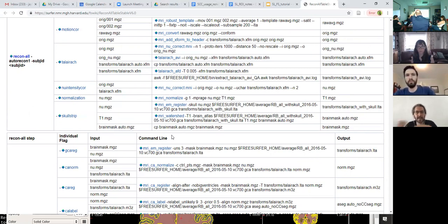If you run it, we have scripts for doing various steps of the process. If you're running it and you're doing an editing, if you're doing a review with edits, we have this process that Bobby and I developed to try to cut down on the chances that you're going to really mess something up. But at the end of the day, it's still possible that one could overwrite some data that's difficult to recover.